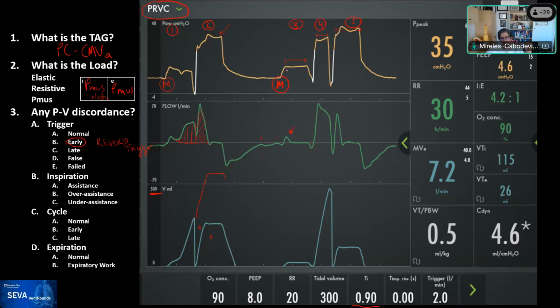So you see how we are in pressure control, and the first breath is very tiny, then the next breath is very tall, and the next one is even taller than the other one. So you see the difference in pressures, how much variability is happening. Alicia, yes, this is only on PRVC that we know of on this, and in volume support. So both of them in this ventilator per se.